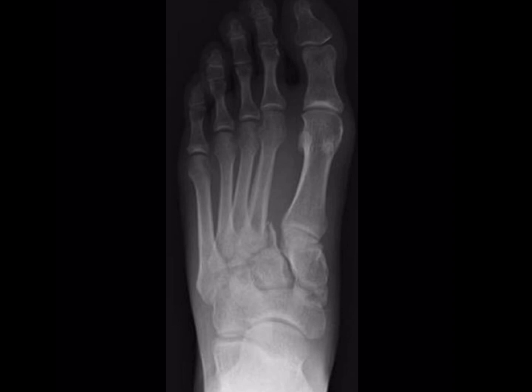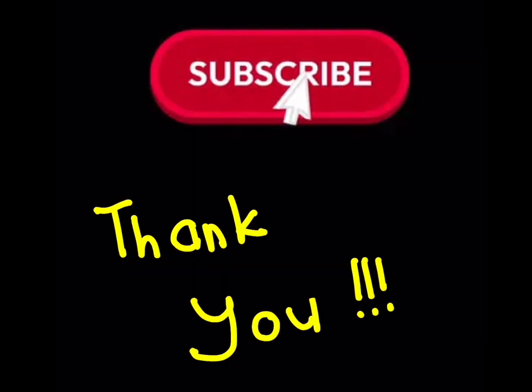Next is Lisfranc fracture dislocation. From this radiograph, we can see that the medial margin of the base of the second metatarsal bone does not align with the medial margin of the intermediate cuneiform bone. In this radiograph, we can see that there is fracture at the base of the second metatarsal and lateral slippage of metatarsal bases.